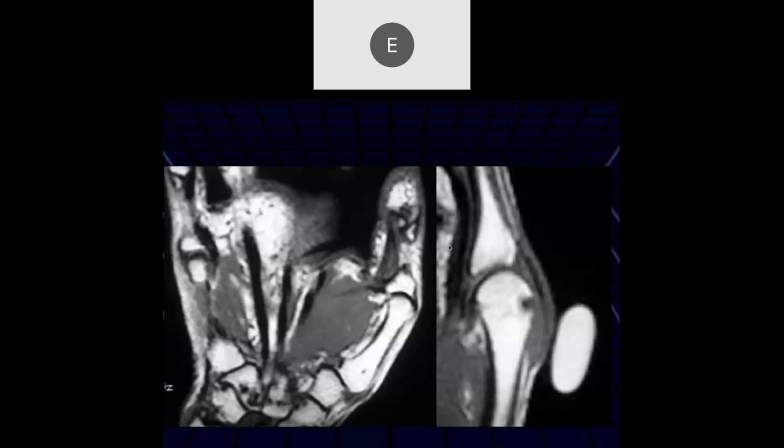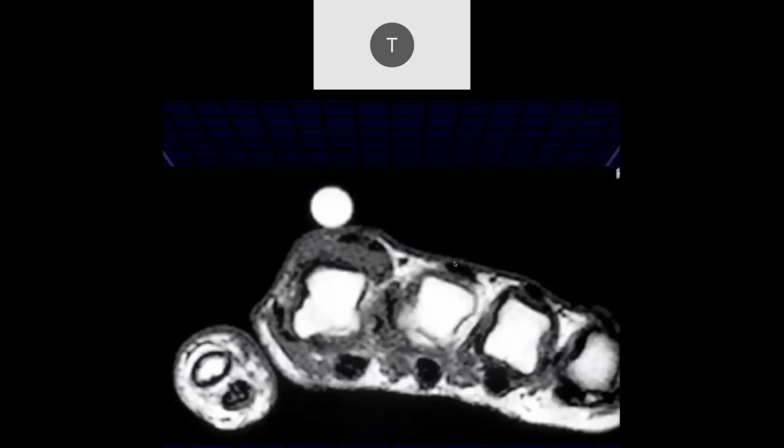All right, so right underneath that marker over that metacarpal, it looks like we have a soft tissue thickening there, and maybe a small erosion at the dorsal aspect of the metacarpal. Here's what the axial image looks like there. It looks very distended, and it's kind of lifting up that extensor tendon there.